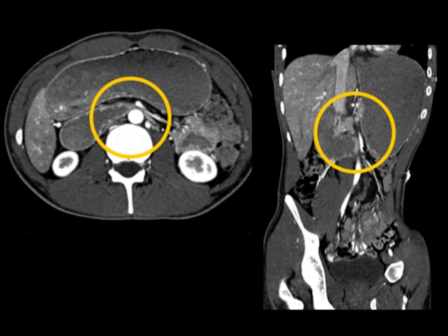When you look at another view a bit further down, now you see the duodenum is obstructed as it crosses between the aorta and SMA. That's classic SMA syndrome. When you put it in coronal view, you especially see it nicely. And if I just target those images, look how nicely you can see the transition point on both those images. And that's really classic SMA syndrome.